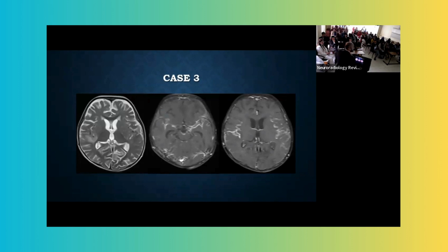I'm sure everybody got that. This is leptomeningitis, okay, leptomeningeal disease, typical pattern, and we have some pattern of basal meningitis as well. So any organism can cause that, okay? TB, bacteria, less likely viruses, but the three are TB, bacteria, and fungi can do that. But basal meningitis is most often caused by TB.